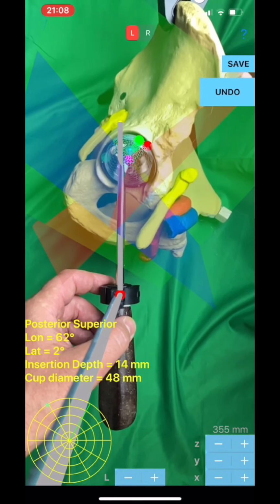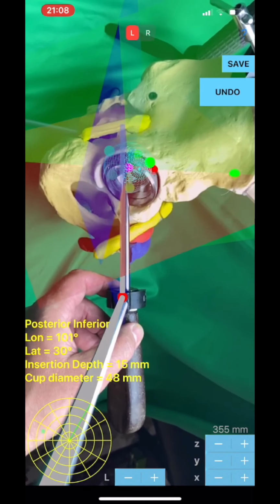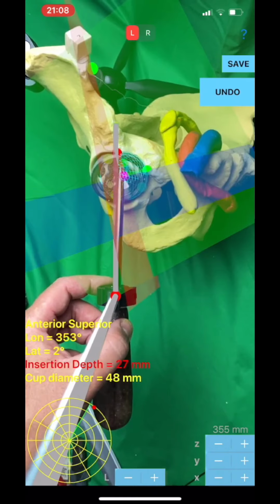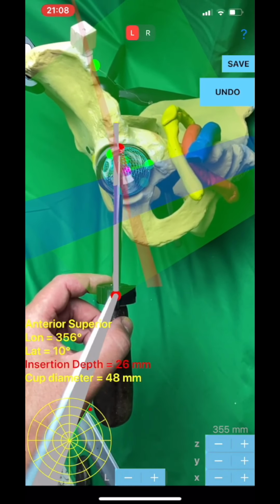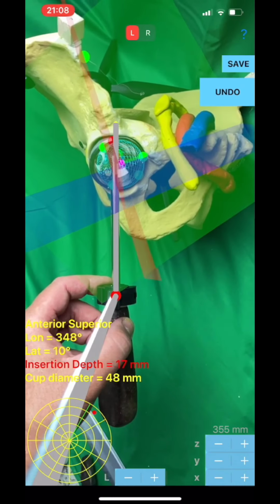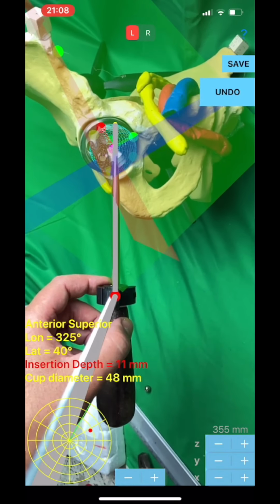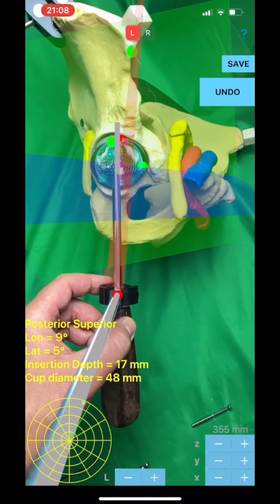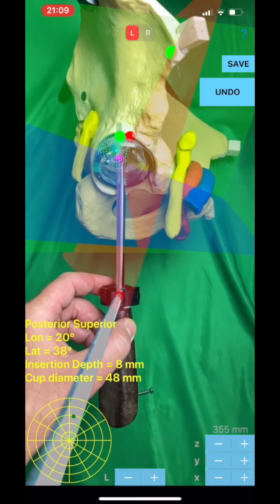Optimum depth screw limit: levels of green correspond to certain permitted depths accordingly. The light green color of the dot in the radar screen reflects that the maximum safe depth for screw placement is less than 20 mm. In other words, if the real screw passes this value while the tip of the screw is in this area, the color of the dot in the radar screen will not remain light green but turns red. Likewise for other areas, green color is for less than 35 mm, and deep green color is for more than 35 mm.